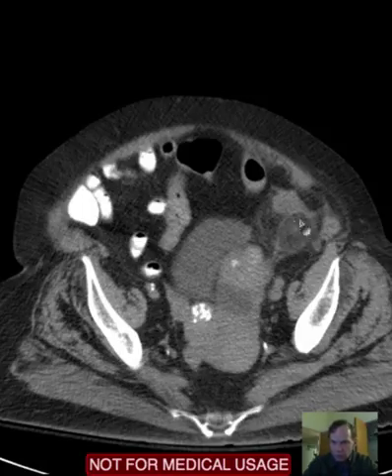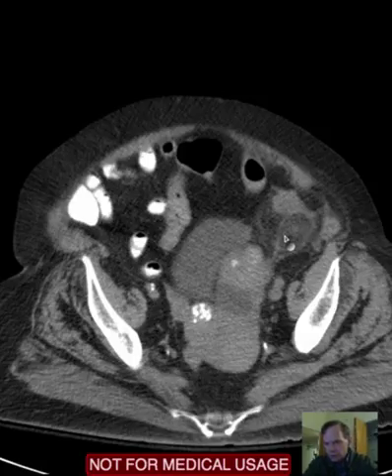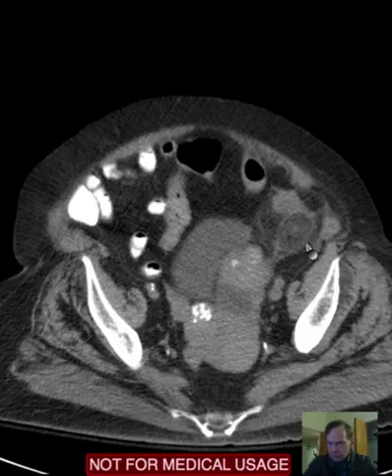However, once again, notice that this is not soft tissue attenuation. It is a fatty structure with this superimposed stranding, primarily in this lobular type of configuration mass here, with more mild stranding adjacent to it.